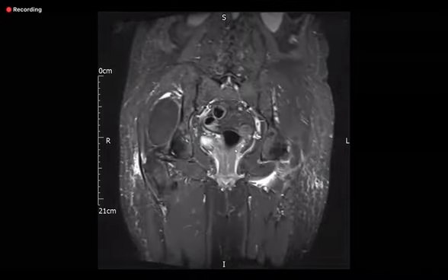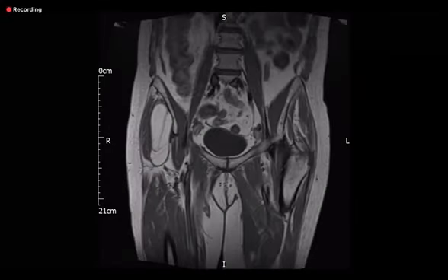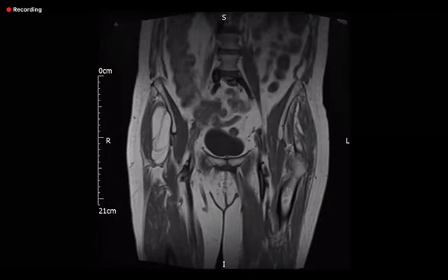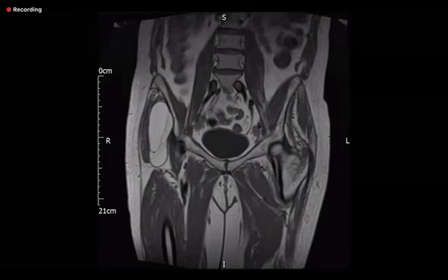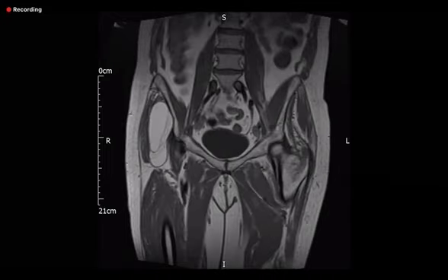Now, as far as this lesion is concerned, the viva points, because yesterday I told you that liposarcoma, frankly malignant, is an exam case, and lipoma is an exam case, and atypical lipoma or suspicious lipoma is also an exam case. Now, if you go back to the basics, size is a criterion. Anything more than 5 centimeters should be taken suspiciously, but that is not a very good criterion. We see so many lesions. But having said that, when you see septations, you should have picked up septations here. These septations up to 2 millimeters are taken as the upper limit of normal.